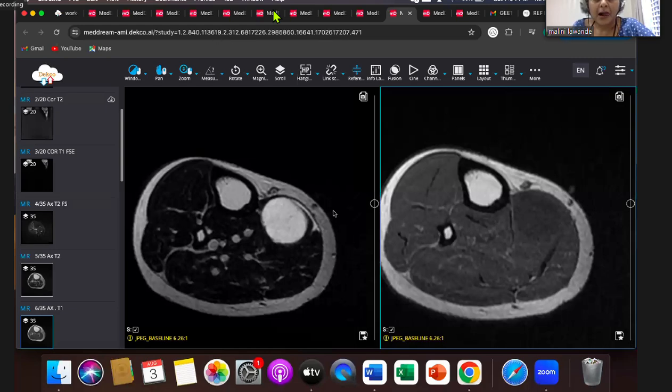Okay, so we are having some differential diagnosis coming up, one being Baker's cyst, one being schwannoma, intraneural cyst, peripheral nerve sheath tumor, hemangioma, lymphangioma, cystic schwannoma, myxoma. Okay, so all of these DDs, fine.